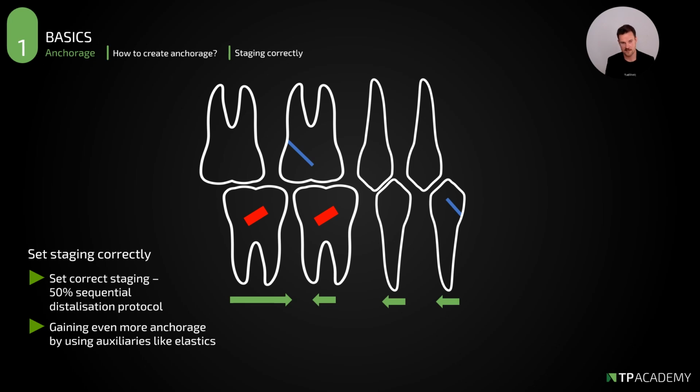Of course, if I have a class 3 correction, if I have a little distalization in the lower arch, we need to be very careful with placing elastics. Some doctors, they use elastics at the end for midline correction, for perfect finishing. And so there are a lot of tips and tricks, a lot of things that I can use, but I need to understand how to use them and also how to place them in the software.